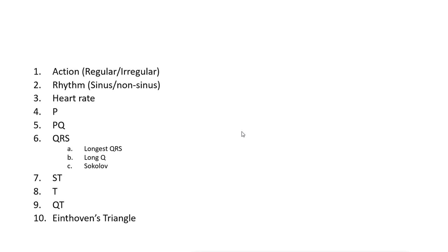But what I'm trying to say is that you don't use that value. You don't mark that as pathological QRS, because it is not representative of the heart's activity. You don't say the heart must have some sort of problem with its contractility, like hypertrophy or something. That's incorrect, because it is an extrasystole.